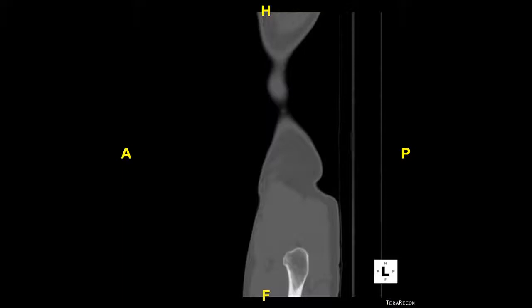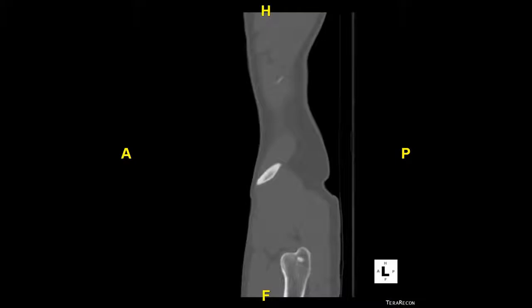The shaft of the femur will start to become clearer in the next few images, but I'm going to scroll through a few more images until a more noticeable landmark becomes visible. Here's the other bony landmark I just mentioned a few slides ago. I'll circle that quickly in black. This is the iliac crest. Let's move through a few more slides for it to become a little more prominent, and then we'll orient ourselves again.